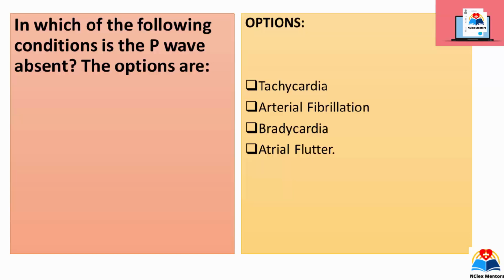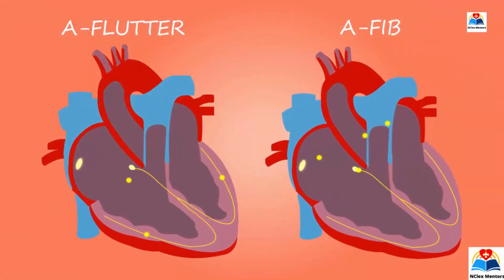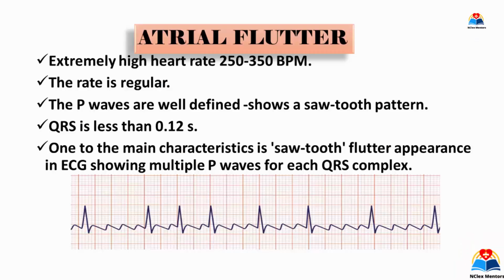The next topic is on atrial flutter, which is another important topic in this section, and we will study it with some practical studies. Thank you so much for staying with me throughout this lecture. Let us see another ECG pattern.